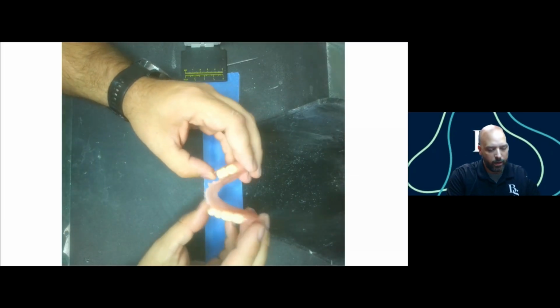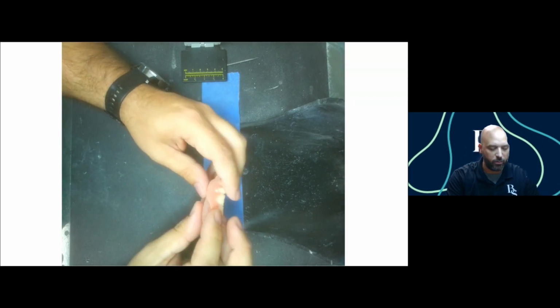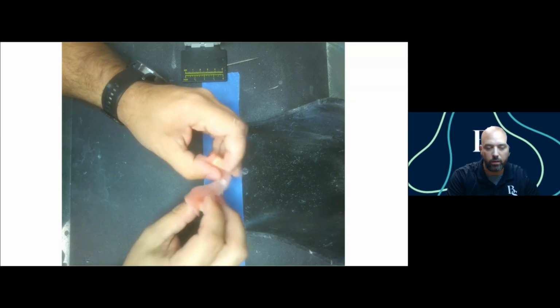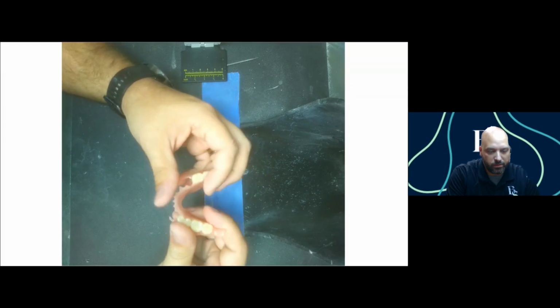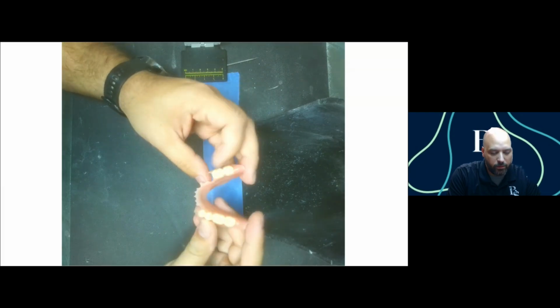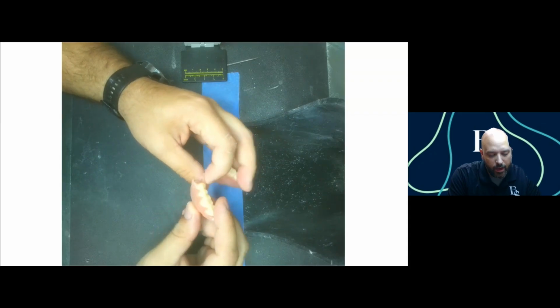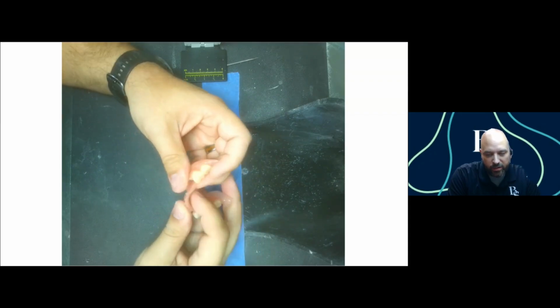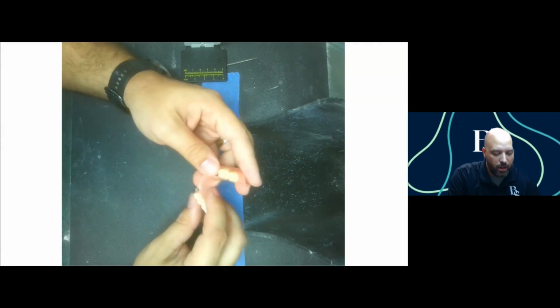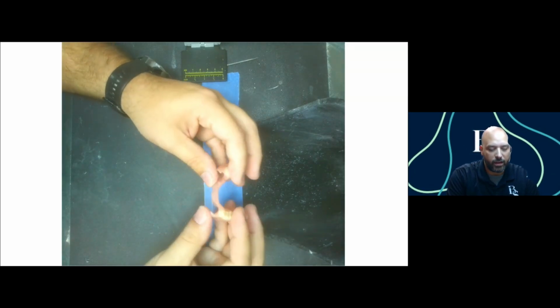All right, so here it is, pumiced and polished and ready to be delivered. I was able to get it nice and shined up. So basically, all I used was normal pumice in a lathe with a normal rag wheel, and then I used a red rouge to polish it real nice. And after I did the red rouge, it's got a lot of that still on it. So then I put it in an ultrasonic bath for about 20 minutes, and that got all of that off. So now it's ready, like I said, for delivery.